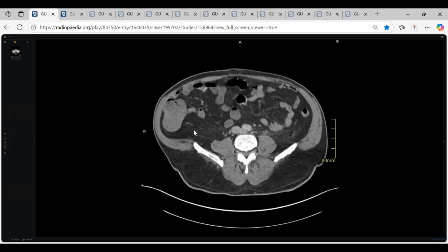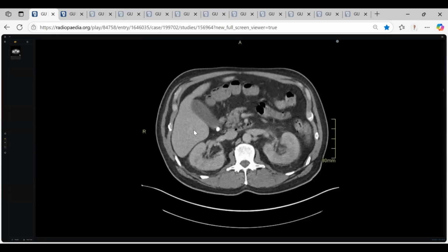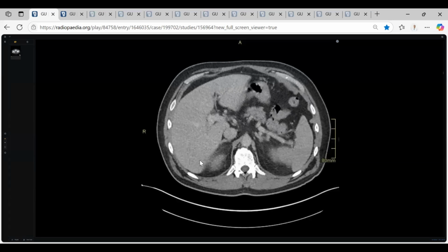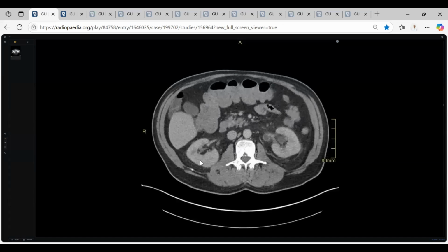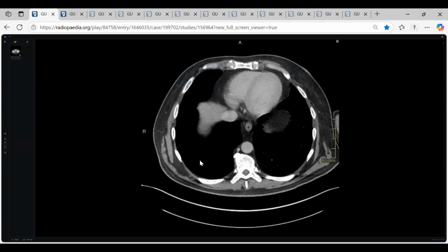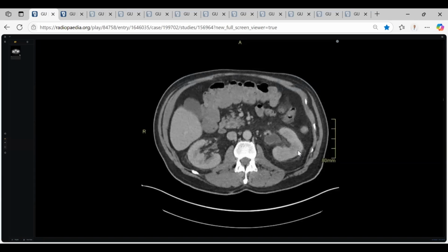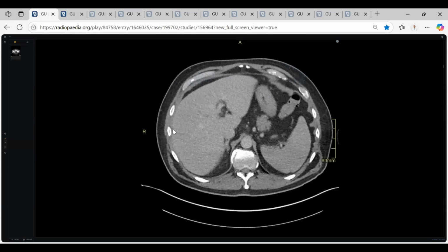Okay, my colleagues, thank you, doctor, so much. Besides that, there are two gallstones at least, and there is some focal nephritis here, but the most important is at the left side. We must exclude in all abscesses a pyogenic liver or spleen microabscesses. This is very important. I know the prostate is drained by the non-mesenteric veins, but maybe the infection is spread from the ureter or the kidney to the bowel or to the nearby mesenteric veins, causing metastatic microabscesses to the liver or the spleen.